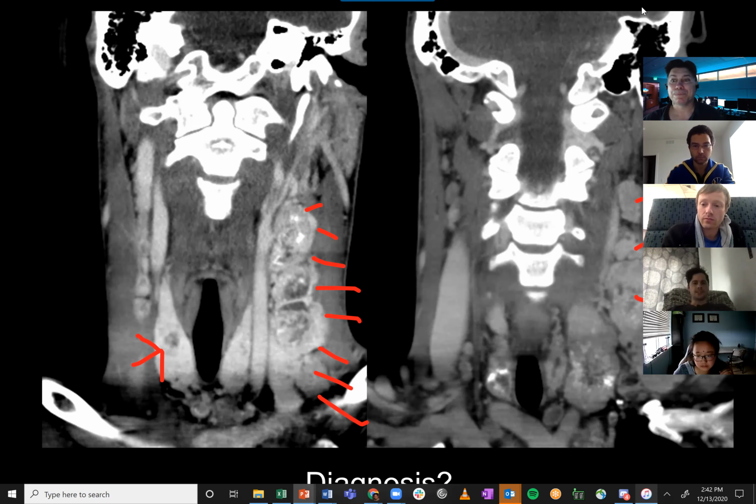As far as the test is concerned, should we consider calcification as the mnemonic for medullary? No, but you often see it. Medullary often has these snowflake stellate calcifications within it. So if we see that appearance, we often think about medullary, but other things can do it, especially treated nodes. Lymphoproliferative disorders, lymphoma, leukemia, CLL, ALL, after you treat them, they may have eggshell calcifications in the nodes. TB, weird cat scratch. There are a lot of other things that can cause weird calcifications in lymph nodes.